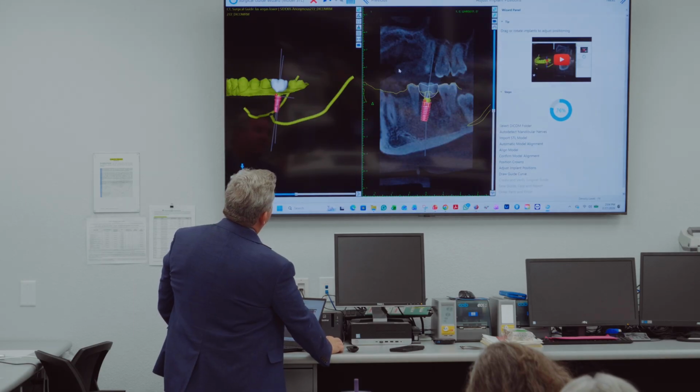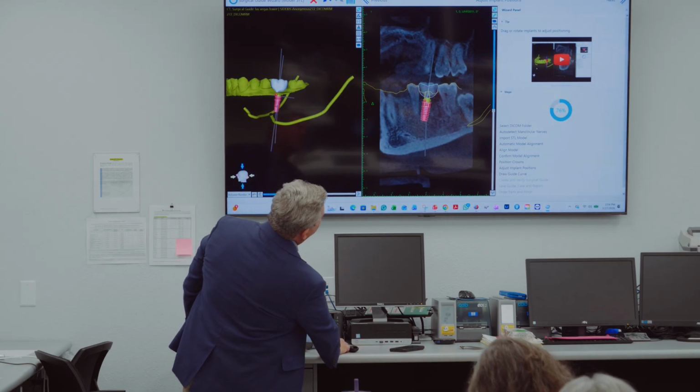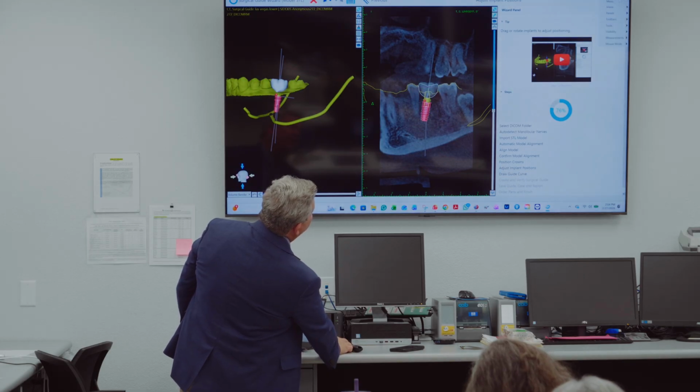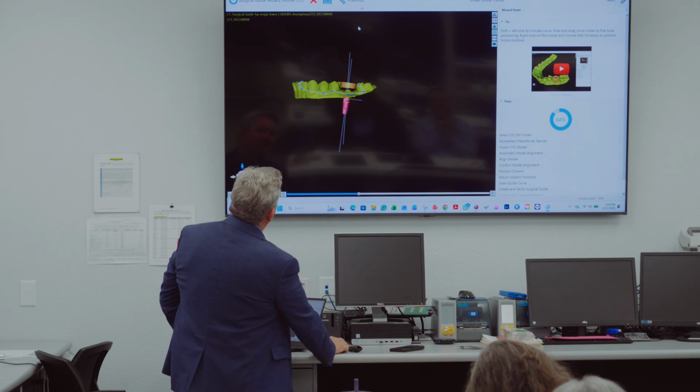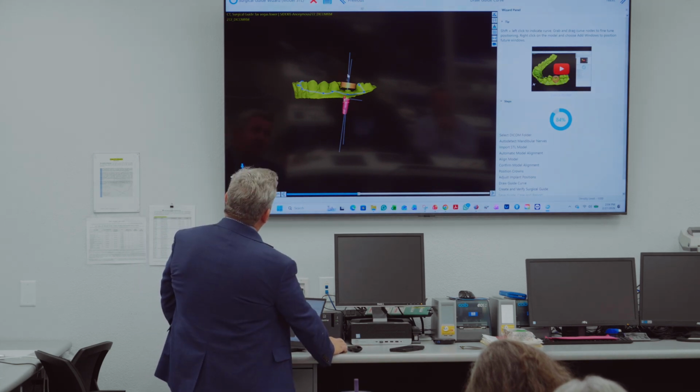Something's going funky here. I don't know why it's doing these weird jumps. And that light is right in my window. I can't see. That exclamation point's not stopping you from moving. No, that's a lock. The light is right where my next is. Oh, here it goes. Okay, so it raised it there. So it raised that offset.